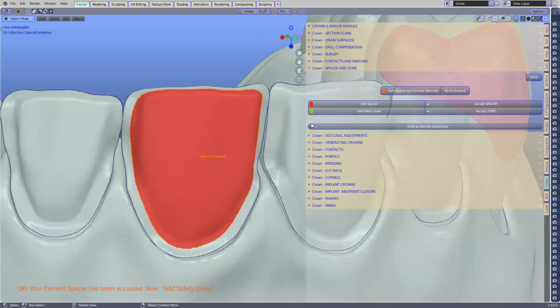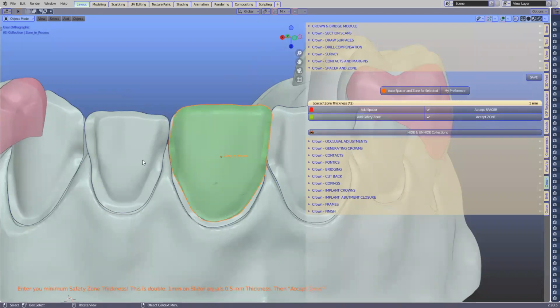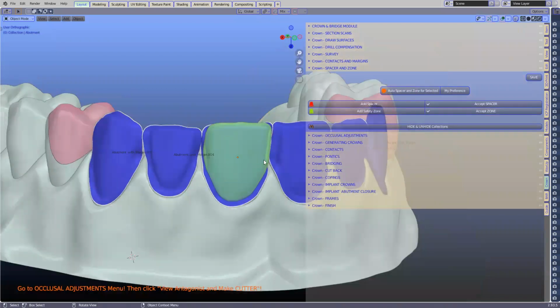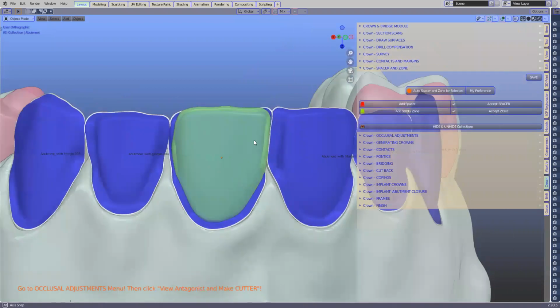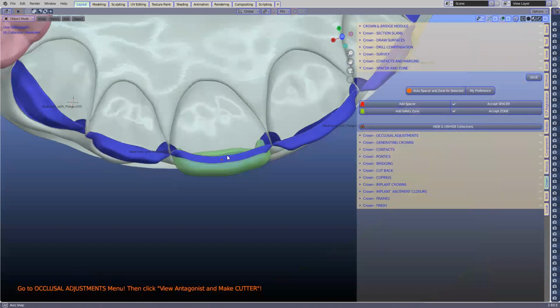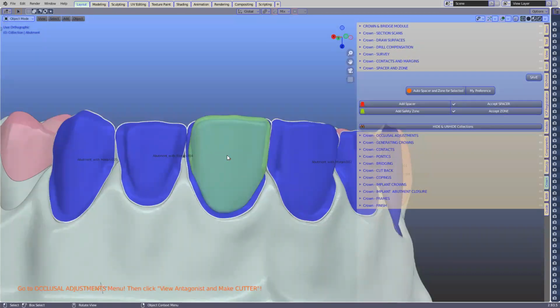Then we're going to build a safety zone around it. Wolfgang, can you just explain this zone? It's a translucent green. It's a hypothetical zone, so it's only indicative. When we have a tooth library that we paste onto this veneer prep, if that green shows through the actual tooth library, we know it's too thin. Currently it's set to, is it 0.6 millimeters, Michael? It's 50 micron.